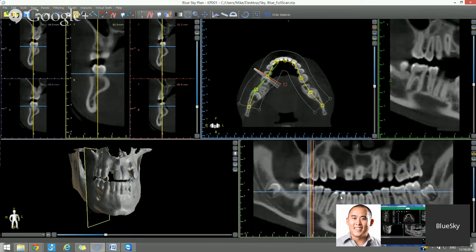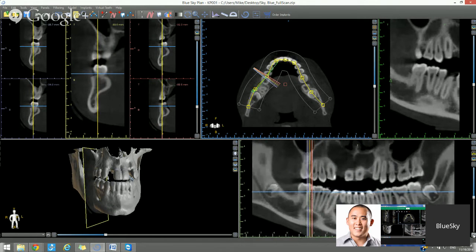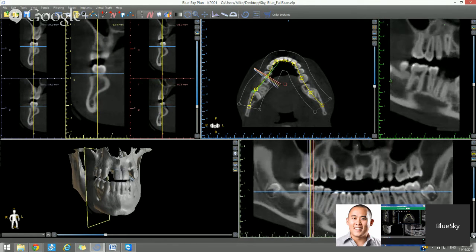You can also go through the slices by using the wheel of your mouse. And as we mentioned earlier, what we're looking at essentially is many 2D images being processed by the software and put together. So when we're going through a particular view and going through the slices, we're going through those images. Okay? What we're viewing now in the 2D view is a 1 millimeter thick slice at a particular location, and we're able to look at the different slices at the different locations.